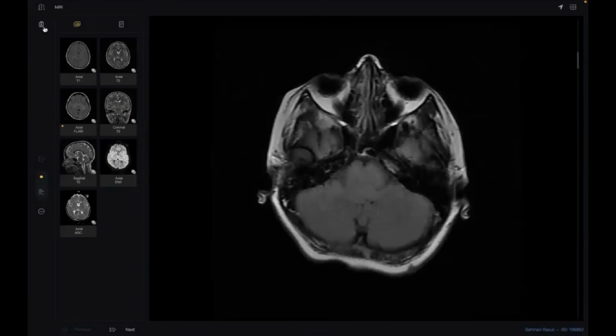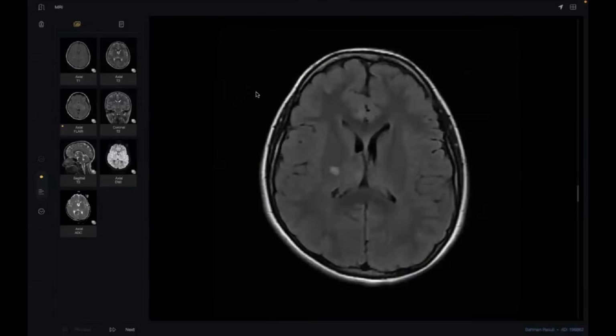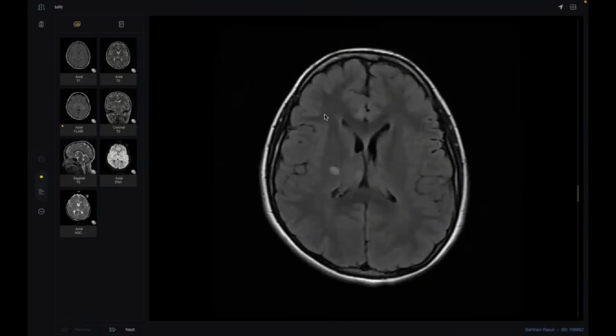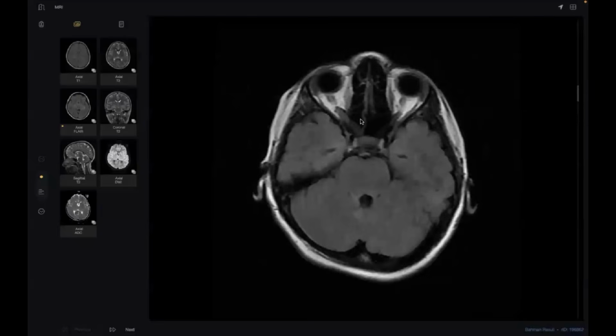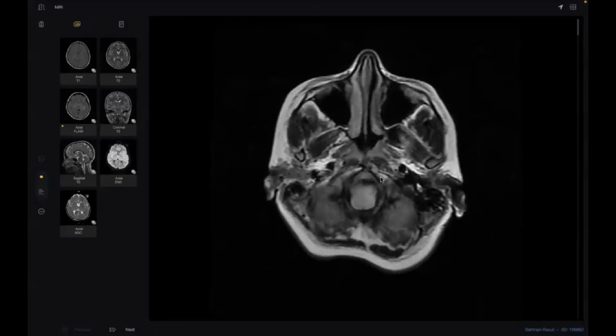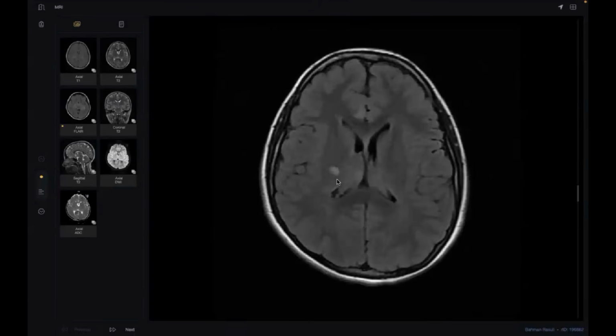Or even this patient is 13 years old, maybe other diseases. Again and again, when we find any basal ganglia signal abnormality like this, before confusing, go subependymal, go subcortical, go to the orbit. Or even to the CP angle for NF2, but NF2 will not present with this fuzzy focal area of signal intensity.